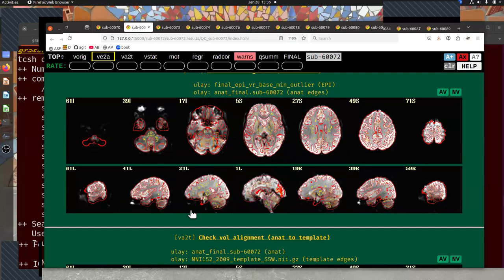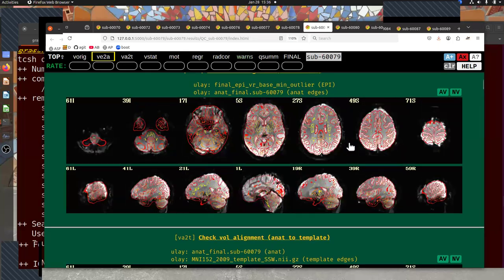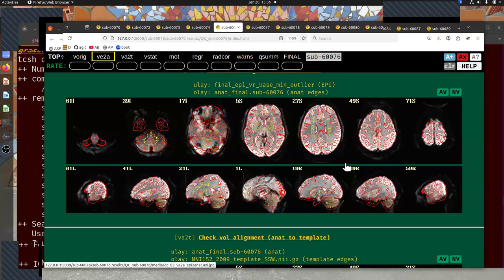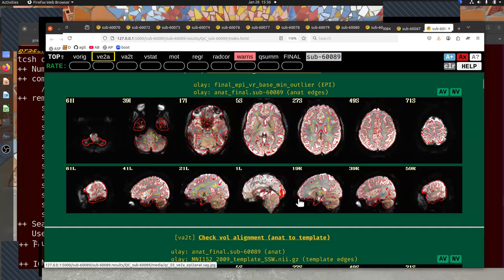Do I really care at this level? But it's something that I'm noticing, or the relative amount of CSF. I also just get a sense of the general quality of alignment, brain inhomogeneity, all sorts of things like this. I'm talking a lot more and going through this repeatedly, but if I just open this up, clicked here, and went through it once, I've done quality control on this feature in under 10 seconds because everything is okay here and I know it.